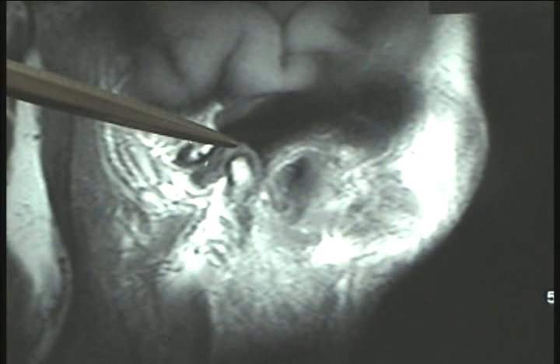Remember her initial appointment when you saw the MRIs hanging on the view box? These are MRIs through the left and right temporomandibular joints in both the closed and the open positions. The big question is, what did they reveal? Because you recall I told you that most of these patients were both Tourette's and internally deranged TM joint patients. And although we have addressed the Tourette's symptoms, it is not sufficient, in my mind, to do just symptomatic treatment. You have to address the prime cause of all the symptoms. It is now time to address the TMJ symptomology.